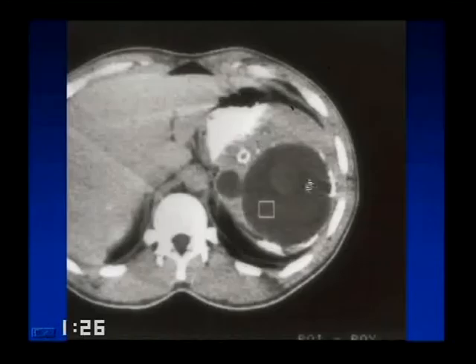An old ultrasound showing, I call it the missing link in anthropology. We see a lot of trauma, but you don't see a lot of pseudocysts, and this is sort of trauma on the way to the pseudocyst. This was in the AFIP files of post-traumatic pseudocysts. There's organizing rings and solid components of organizing hematoma. And this is a similar case where you have multiple lesions, some with calcification. The dominant lesion has ring-like calcification and heterogeneous round areas of high density within, representing organizing hematoma.